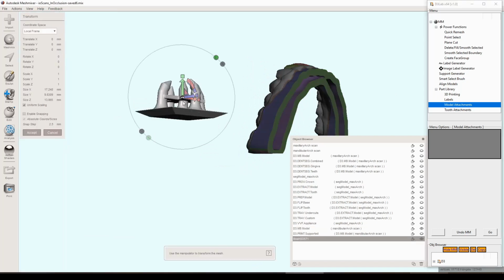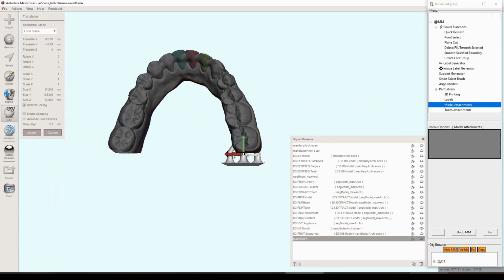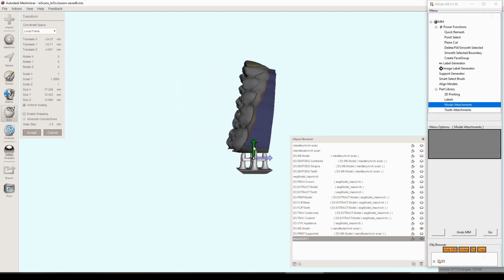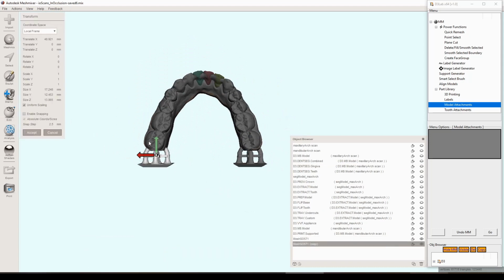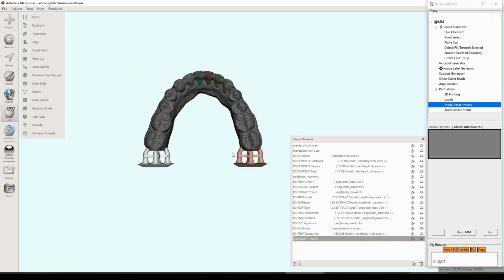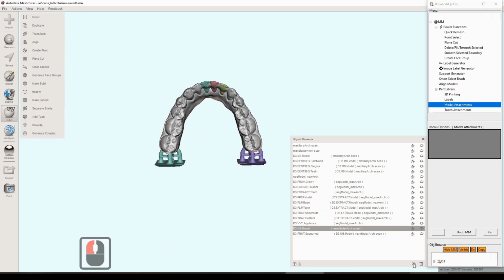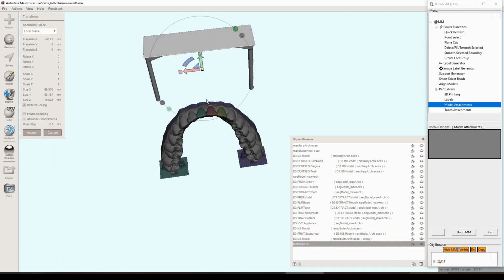And once you get them oriented in the right position, it's actually not a bad little thing. It's got a little bevel to it at the underside, so you can just pry it off when it's done 3D printing, whatever it's attached to. It's generic, so you can just add it to pretty much anything in case you didn't want to use the support generator that's included in the tool and/or Meshmixer.